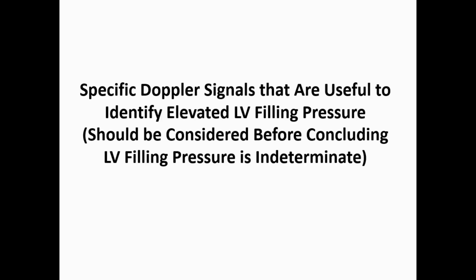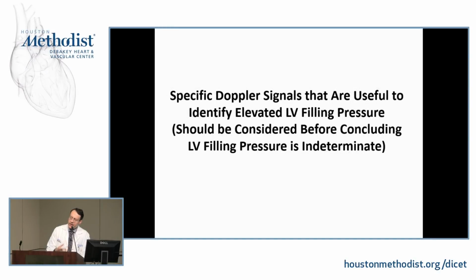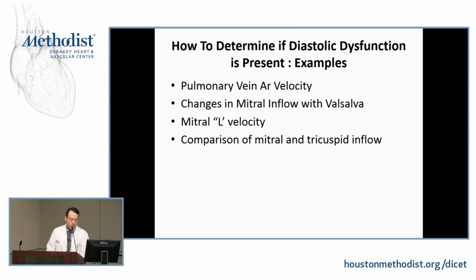Next, as we are going through the study, we need to look for specific signals that tell us that LV filling pressures are elevated. It is important to look for these signals and think about what they say before you conclude that LV filling pressure cannot be determined. Okay, what are these signals?